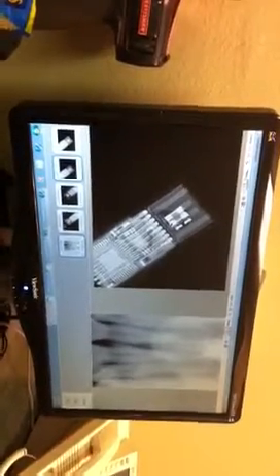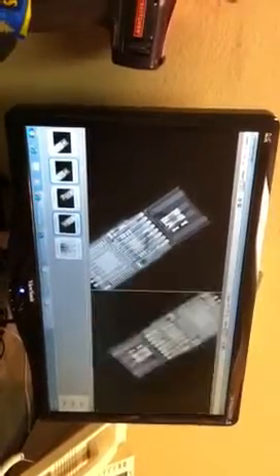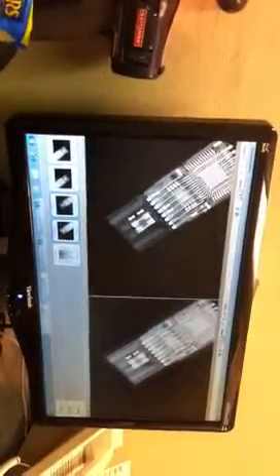You can do that. So this thumb strip, film strip down here, is to allow you to then actively change the comparative view. So you're keeping one fixed and you're comparing it to the others. Okay? All right. So let's go ahead and exit out of here.